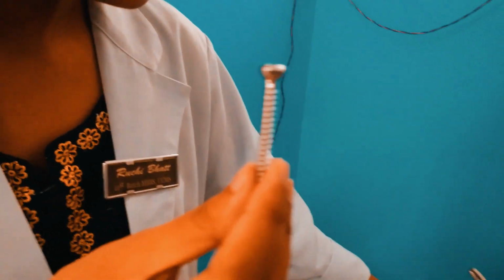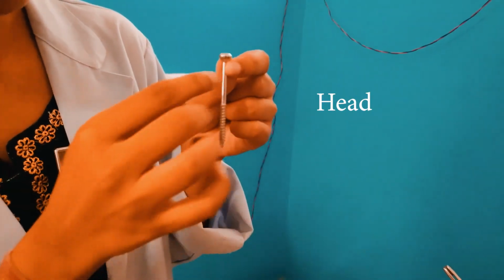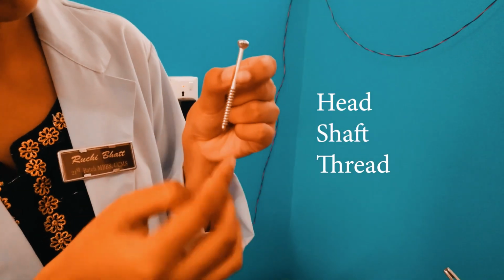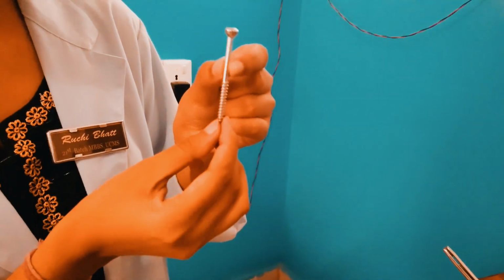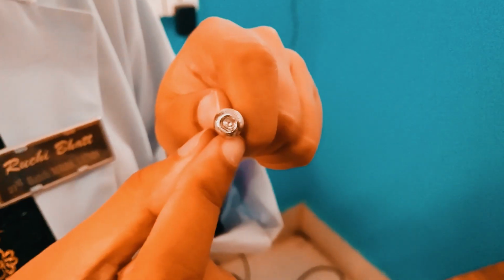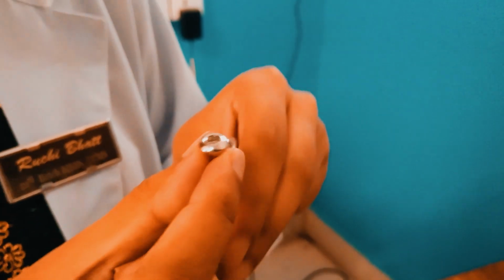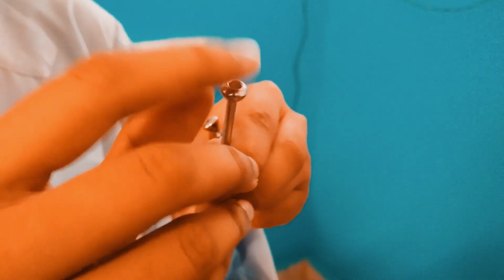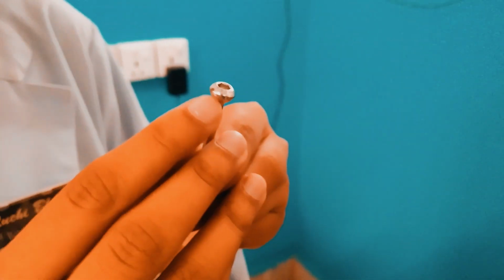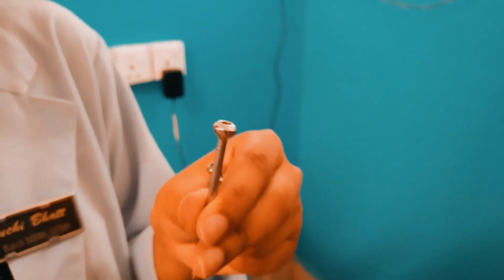It is a cortical screw. So now this is the head, this is the shaft, this is the thread, and this is the tip. The head consists of a recess. It is a slot for the screwdriver and is very specific according to the screwdriver. Below the head is a part of the head, the countersink. It can be normal or threaded according to the locking screw or dynamic screw.